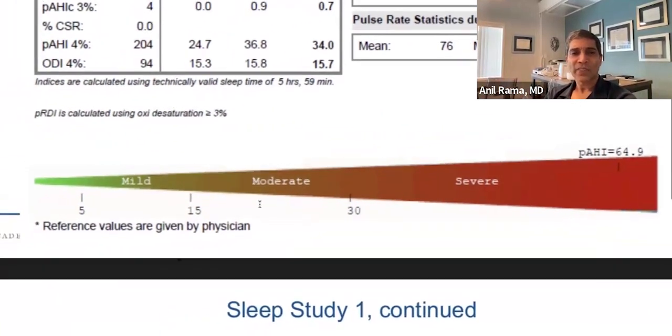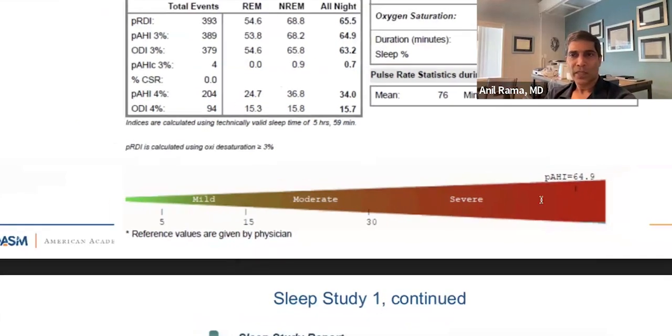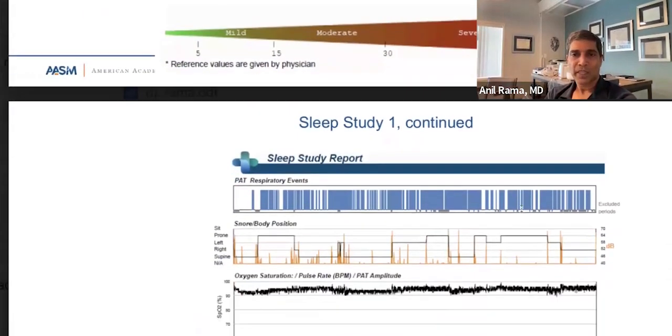And then this is just a graphic, and it shows where this person is on the sleep apnea, and it only has the AHI, and it says, oh, it's very severe. I asked the company, can you please put RDI on there, because the International Classification of Sleep Disorders uses RDI in the diagnosis of sleep apnea. If your RDI is 0 to 5, you're normal. 5 to 15 with symptoms, you're positive. And so on, right? But they said they couldn't do it. So I said, okay, whatever. I guess it's technically not possible for them to put that on there.